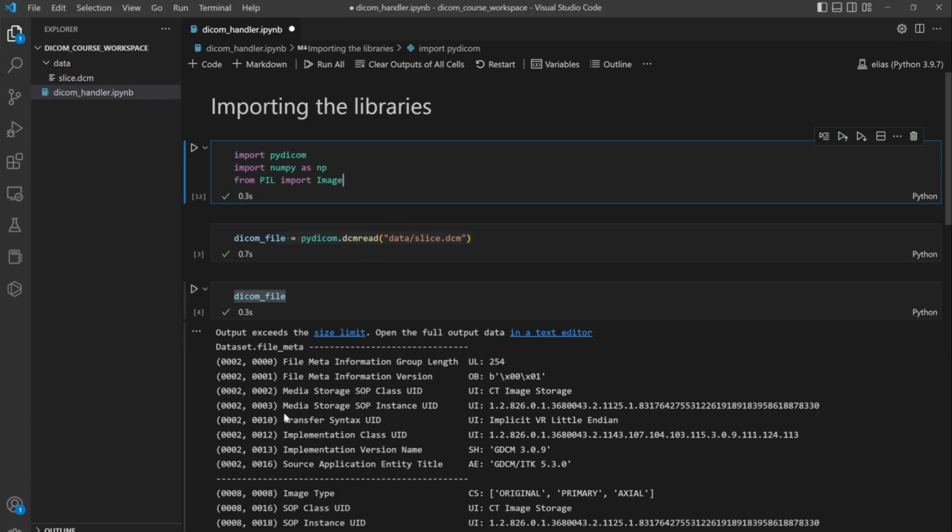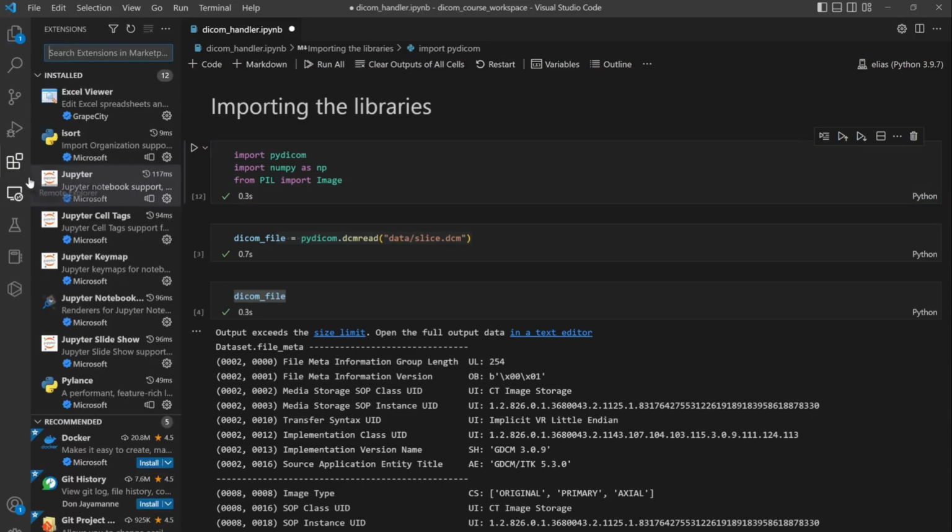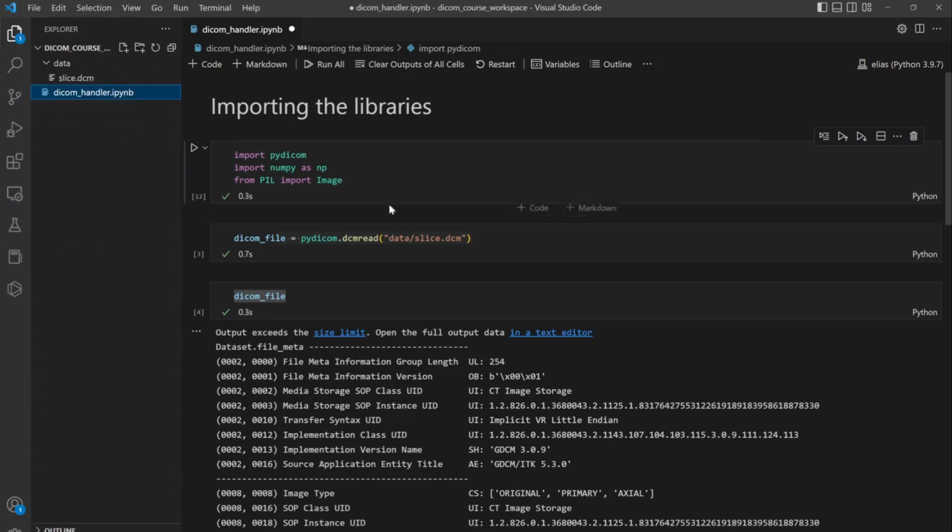This is due to an extension called Tabnine. I installed it for free. It is just here in the extensions. You can just search for it and install it. It will help you a lot when you're doing your code, and it will speed up your work. Not all the time. Sometimes it gives you something wrong, but most of the time it will help you. So maybe if you are asking how to do that, you can use it here.